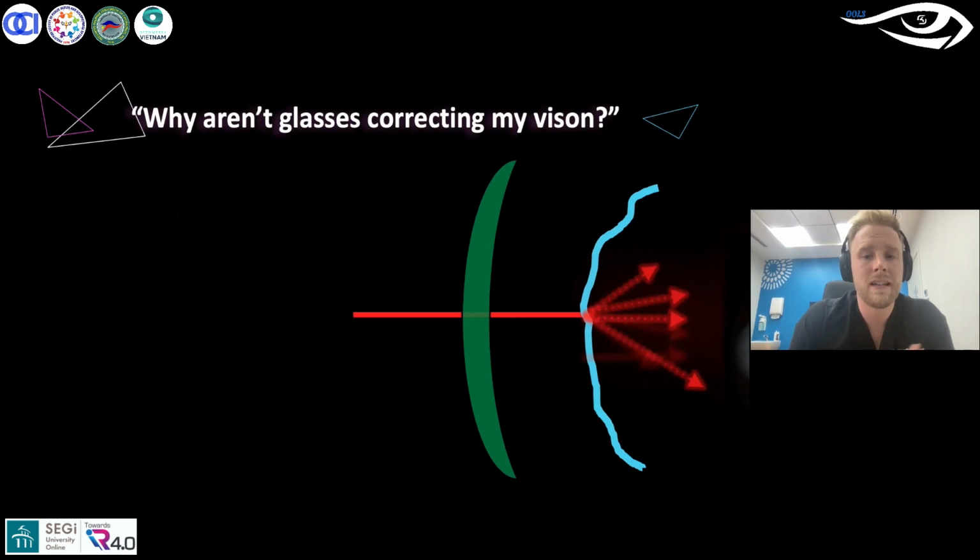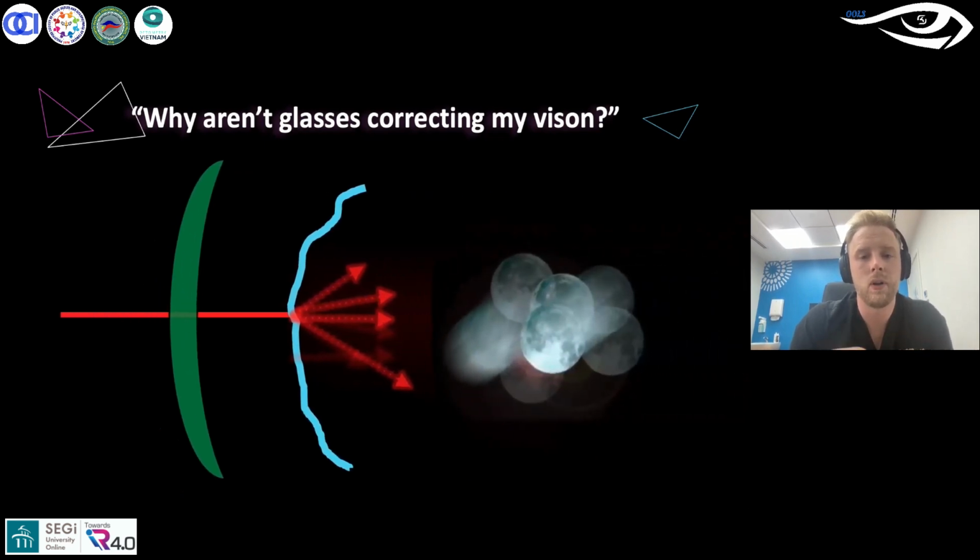And what does that result in? So generally you're going to have these sort of ghosting, shadows, these higher order aberrations really causing problems for the patient. And I used this example. I had a patient about a month ago, and when discussing her vision goals, one of the things she said was, I just want to see the moon clearly.